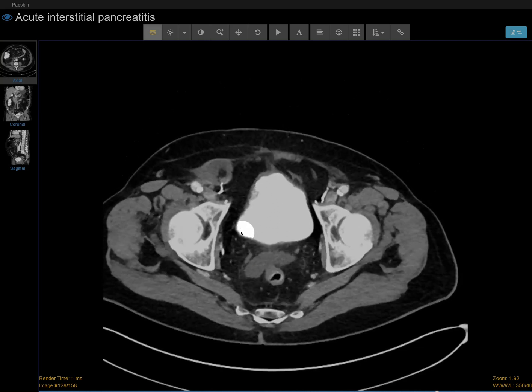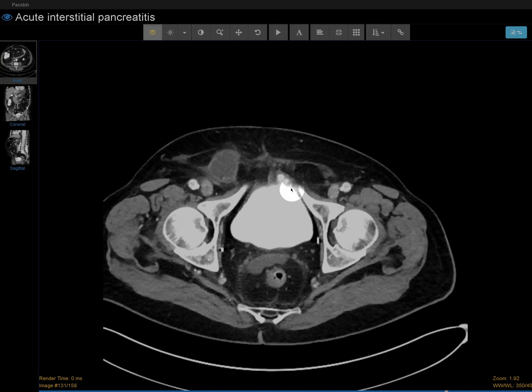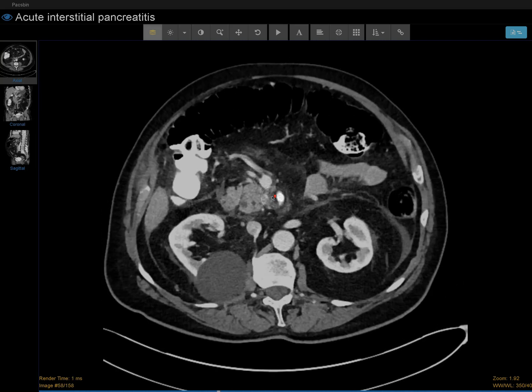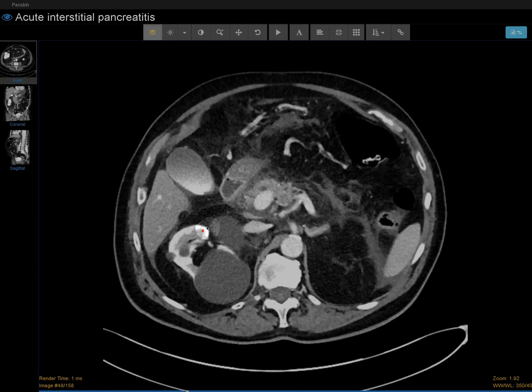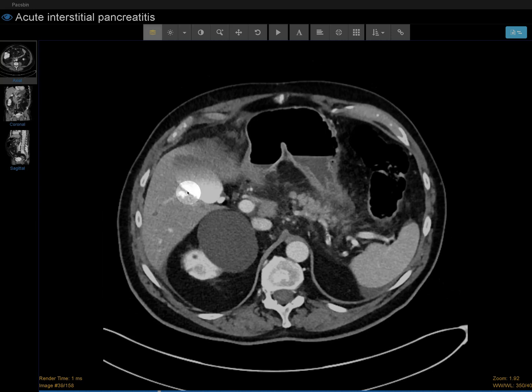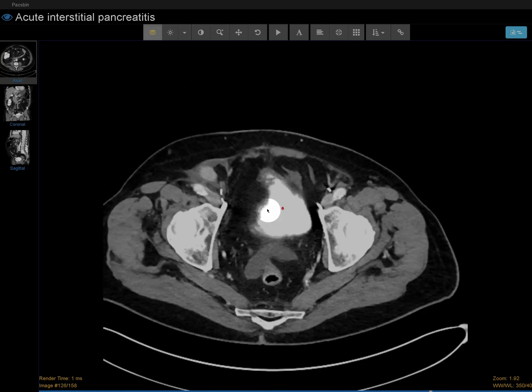And there is contrast in the bladder. Now, I know that this contrast is not from the CT scan performed right now. The reason being that right now the contrast is buried in the cortex and maybe making it to the medulla. So remember this vicarious excretion of the contrast I was talking about before. This patient probably had a CT scan, I don't know, a few hours, couple days before, and it slowly made it through the kidney to the bladder, and the kidney was not doing a good job, so the liver started to excrete the contrast into the gallbladder as well.